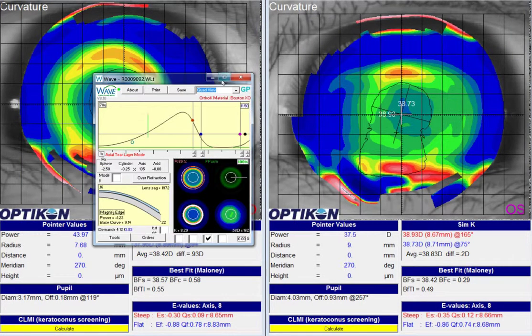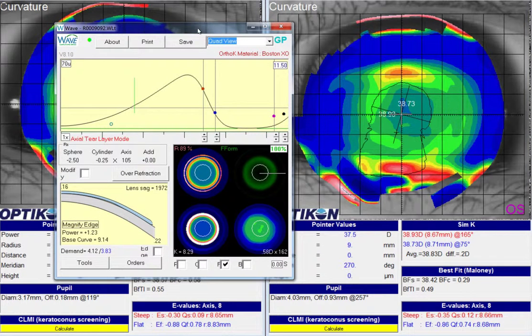Here we have a perspective lens design. This is a new lens design. Right eye, I'm in freeform mode. I did turn the blending back on. I unchecked the box because I increased the OZ and IC to 7 and 7.6.